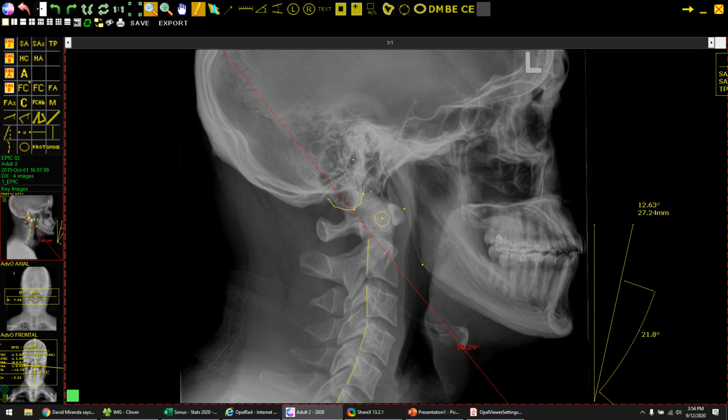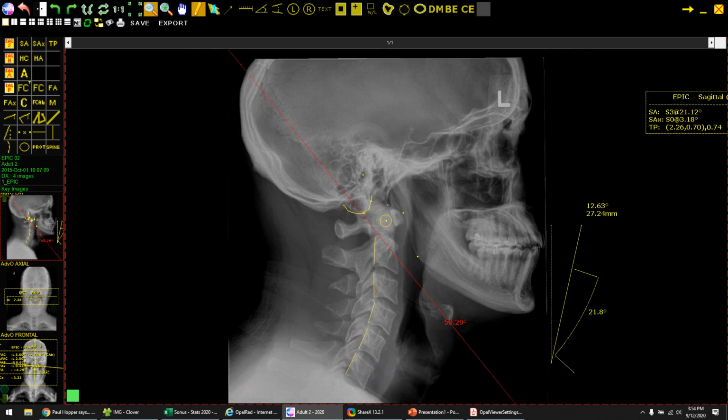A fun thing that we like to see also is: are there any elongated styloids? If you mention that in your presentation, you'll get a lot of oohs and ahs. That's something that Dr. Stan presented on, I think about 2 years ago now. Yeah, that creates some good waves in the upper cervical community.